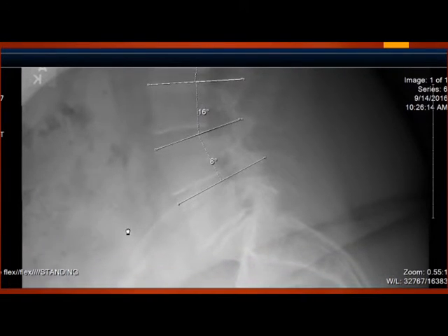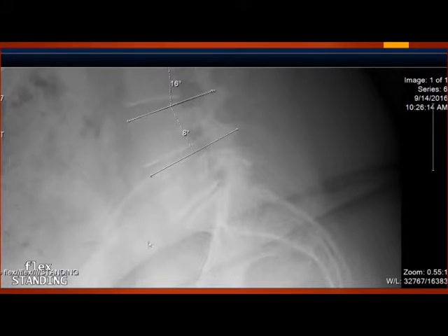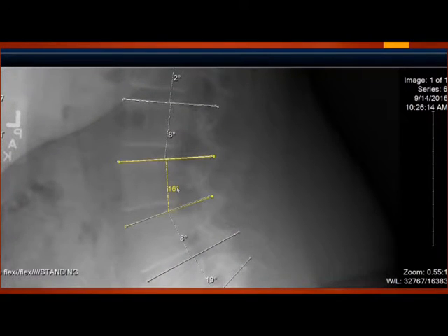Okay, and finally, let's get the L5-S1 angle as follows. And I love these digital tools because they're so precise and so pinpoint. And the software does the measuring of the angles for you. Okay, so that's -2 degrees, -8 degrees, -16 degrees, -8 degrees, -19 degrees.